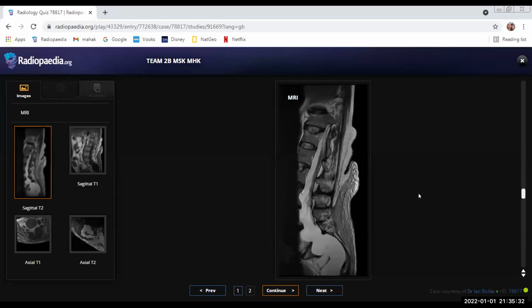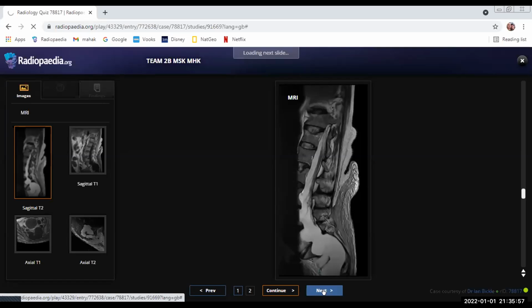This case was all about differentials. So what are the differentials of dural ectasia? Yes, for dural ectasia, it can be achondroplasia. It can be neurofibromatosis. Those are the two differentials which come to my mind at the moment. Okay. You can memorize it like men in Marfan's and Ehlers-Danlos as connective tissue disorders. Okay, Dr. Mahak, my time is up, so now you can go to the feedback.